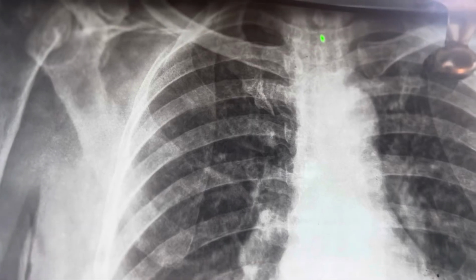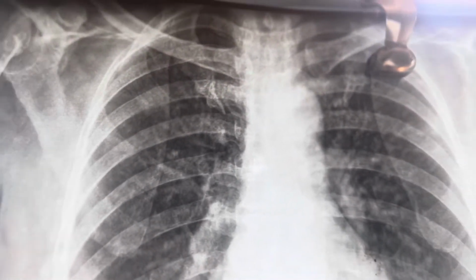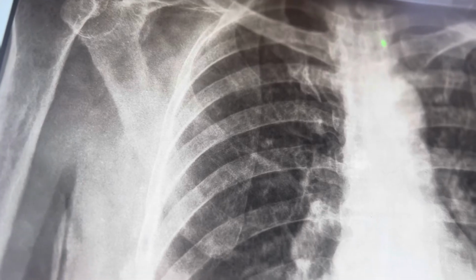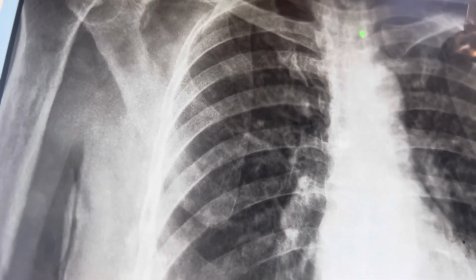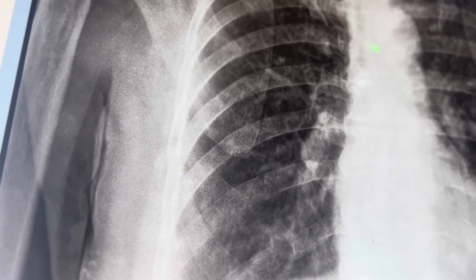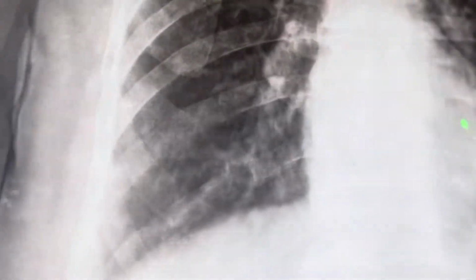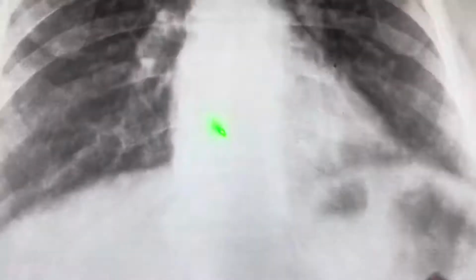This is the trachea. In the trachea we can see the air. Because this is the posterior anterior view, we can't see the vertebral column clearly. Here in this part, the shadow of the trachea is covered by the cervical vertebrae. That's why we cannot see the clear part of the trachea. More down we can see the mediastinum. The mediastinum is occupied by the vessels of the heart, like the ascending aorta and arch of the aorta. More down we can see the shadow of the heart.